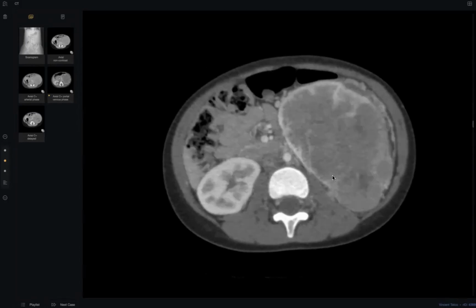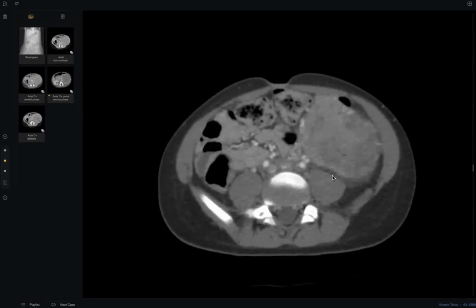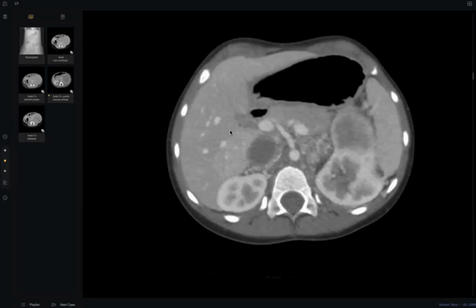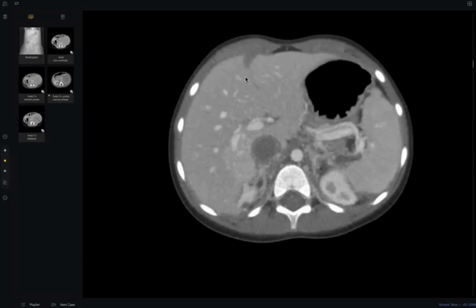This requires proper CT staging of the chest as well as bone and other lesions. I'm also suspecting liver metastasis in this segment. There is an area of hypodensity. Where? Show me, please.